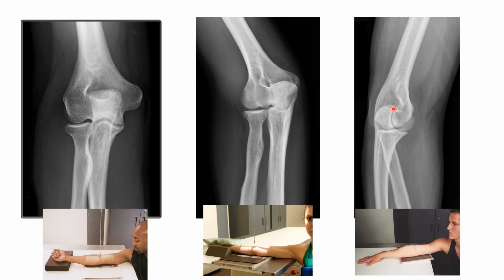So we can see the wrench-shaped ulna wrapping around the trochlea here. So the trochlea is on the medial side, the medial epicondyle, right? So those structures are what we will describe as in profile for the internally oblique elbow.